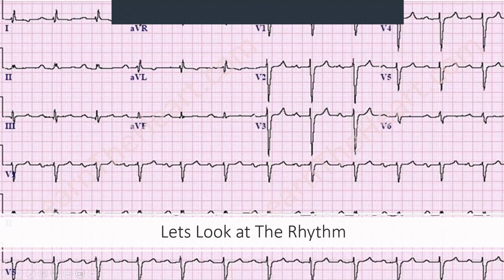Between the atrium and the ventricle, sorry, there's a delay. That's about it. There's nothing else happening. So in terms of severity, is that very bad or not too bad? It's just a delay. That's it. You compare it to the last ECG that we had, not actually that bad.